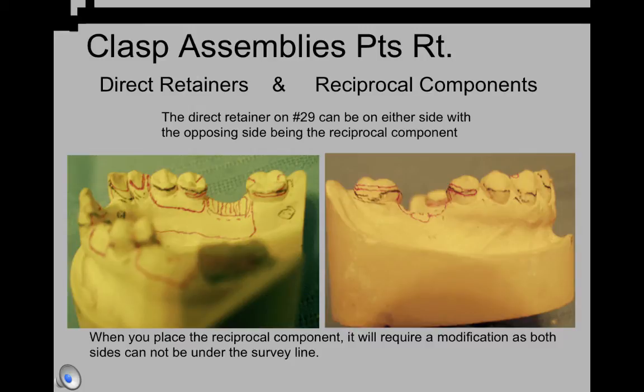I also chose the lingual surface of tooth number 29 for a mesiolingual retentive arm. Again, I had to dip down on the lingual with my major connector to be able to place an arm on the mesiolingual. I also had to place the distal incisal angle rest on the distal of the canine to provide support for the two incisor replacements near the edentulous area.